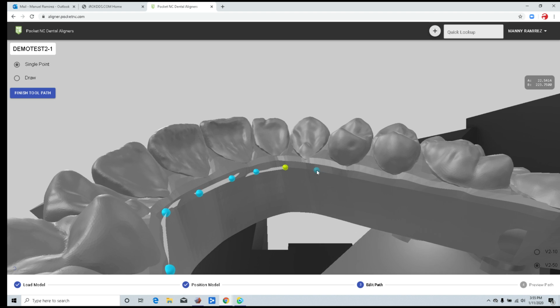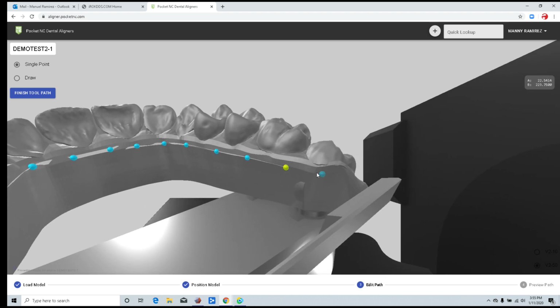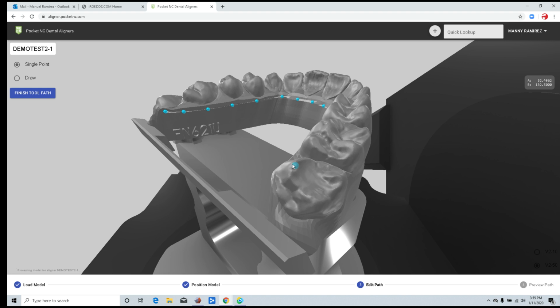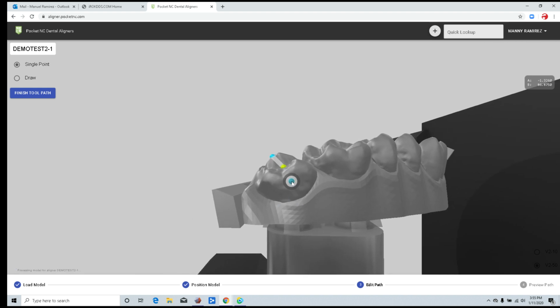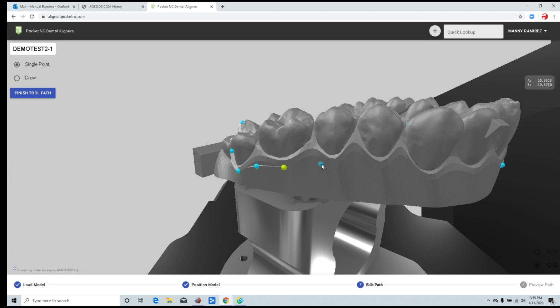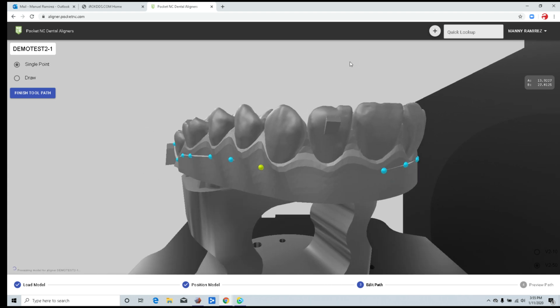So let's try to speed up this trimming strategy here. Hopefully we won't have any collisions. If we do, we'll create another video later where I can present something and be more prepared. But for this presentation, I'm going to try to keep it very simple.